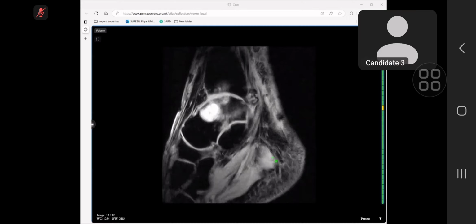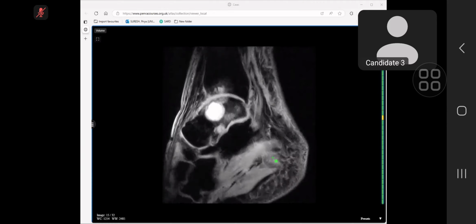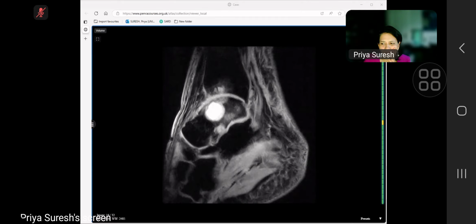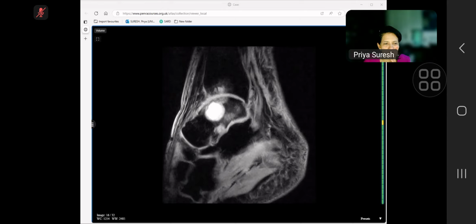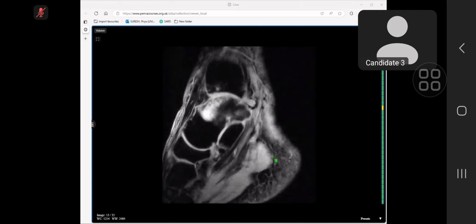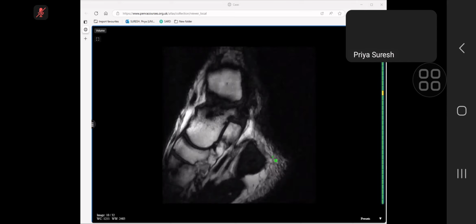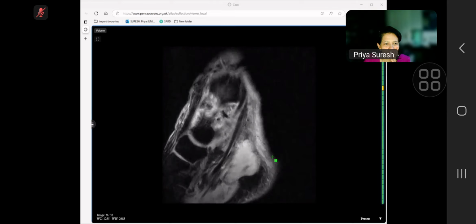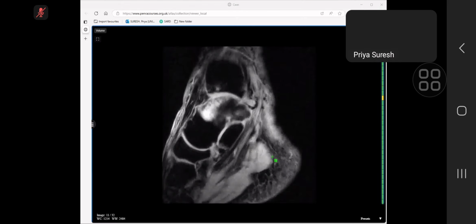Okay, I'm provided with in and out of phase images of the ankle joint in which there are lobulated hypo and hyperattenuating lesions, which are noted in the tibio-talar joint space, and there is destruction and marrow signal abnormality involving the tibia, and reduction in the joint space is noted as well. These lobular projections are also noted involving the calcaneal talar joint space as well.